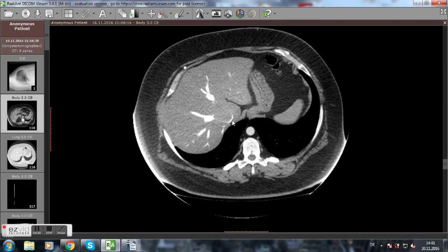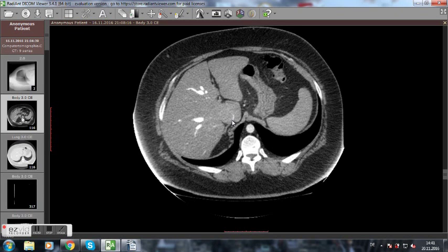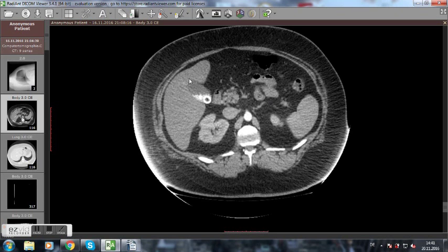The incidental finding in this CT is in the gallbladder. Here we are now in the abdomen. Here is the liver. Here is the spleen. Here are parts of the stomach. And if I go more down, you can see here, this is the gallbladder. One more time, I will mark it for you. This all is the gallbladder.